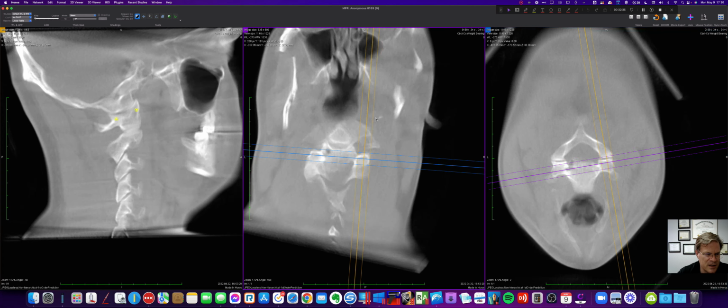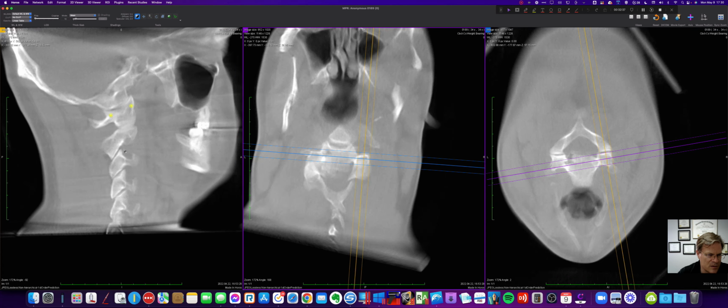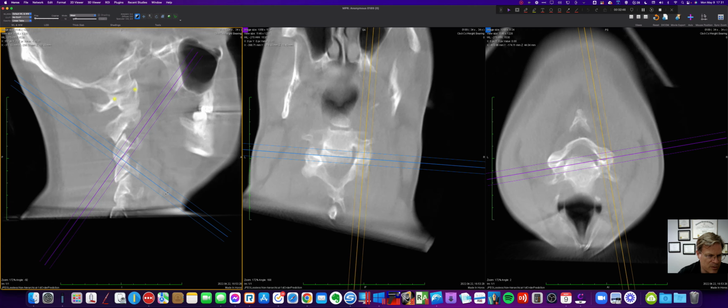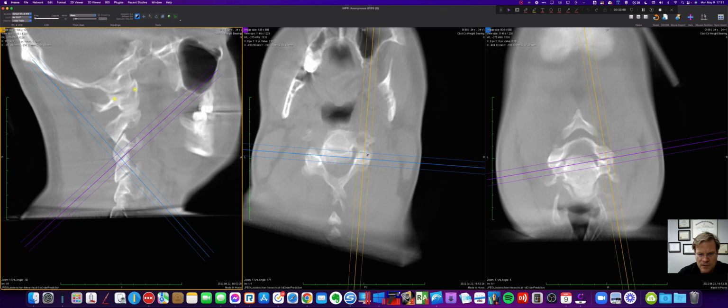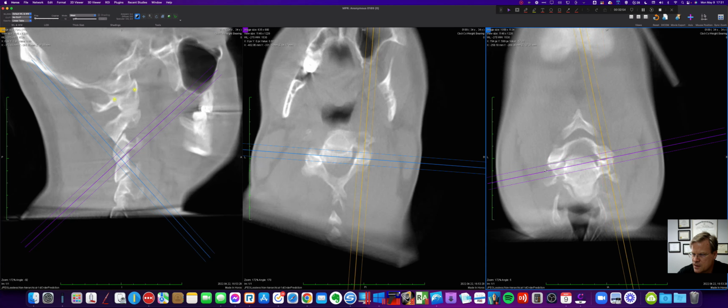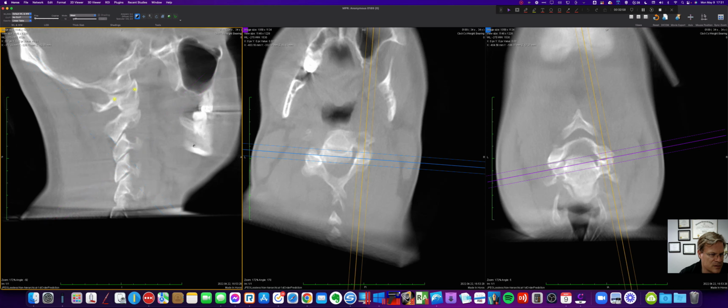Let's go down to the next one. Computer, good. And let's take a look here. Let's line it up. Got the joint there. This one is a deformed one. Who knows why? I don't. All right.